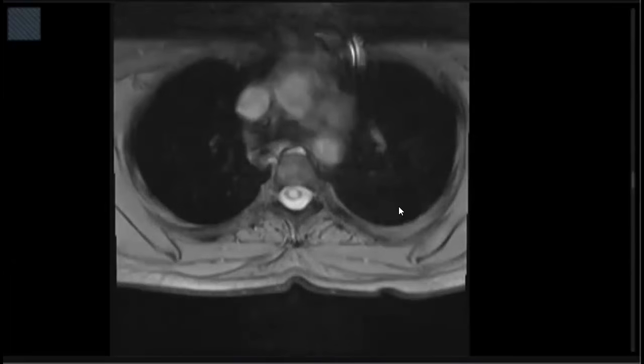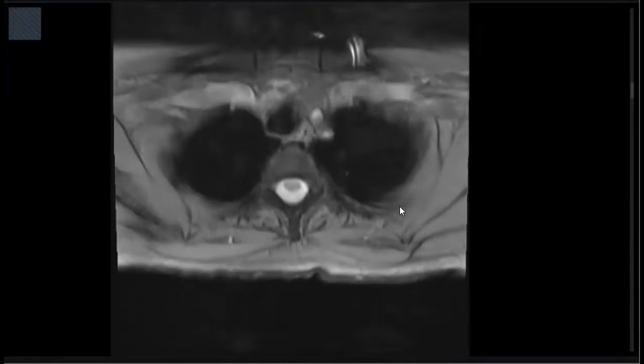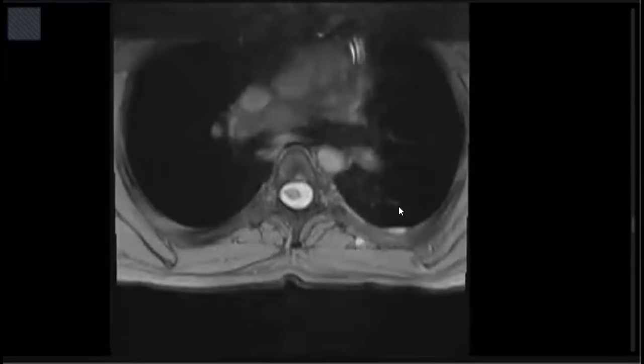This could represent a lateral meningocele, because the spinal cord is seen in the center and is mildly displaced towards the right side. So, with lateral meningocele and these cutaneous nodules, it could represent a case of neurofibromatosis type 1. I would like to correlate with the history of the patient, any previous imaging, and any family history.